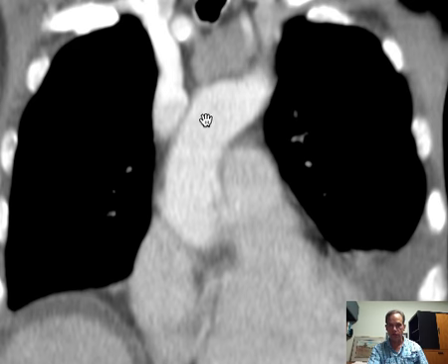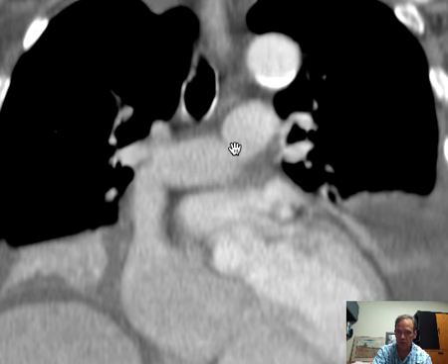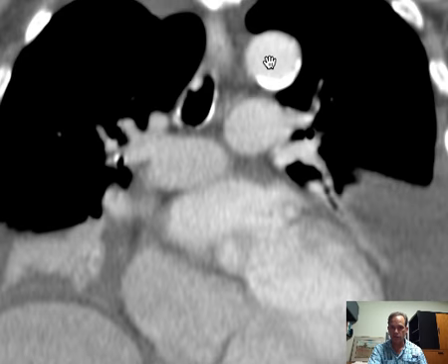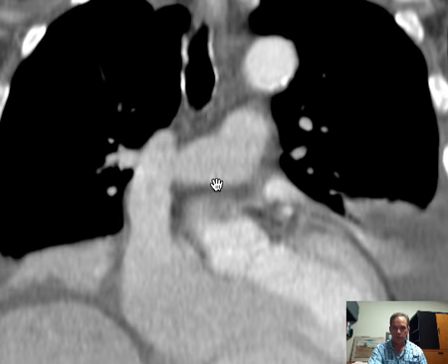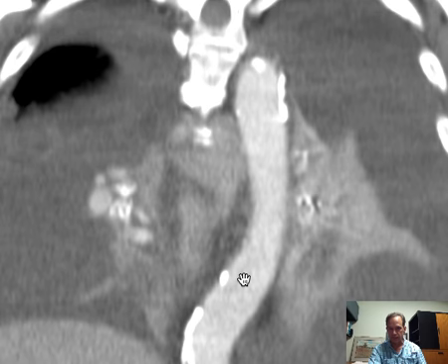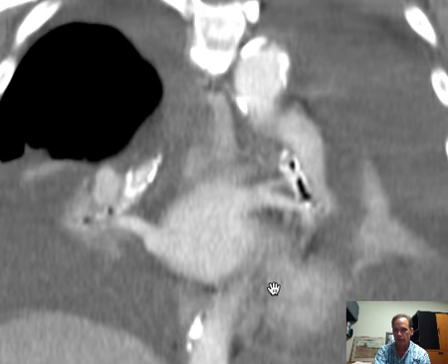Well, here's the aortic arch. It's arching up and then backwards and over. So if we look at this main pulmonary artery going under it, here you can see it goes off to the right and left. Where? Under the aortic arch. This is part of the aortic arch, as you can see. There it is, the aortic arch, and then you have the descending thoracic aorta, which then goes posteriorly and descends, and is a little tortuous, which happens with age, and particularly in patients that are hypertensive.